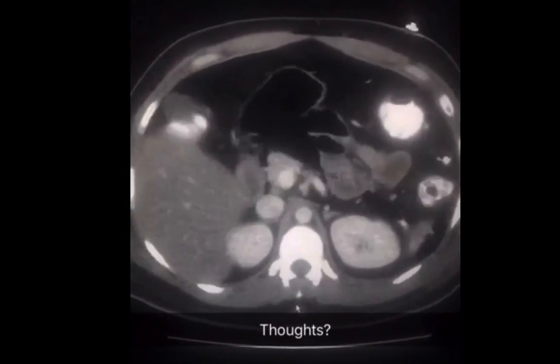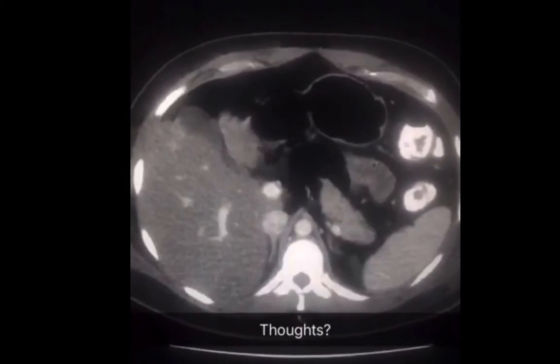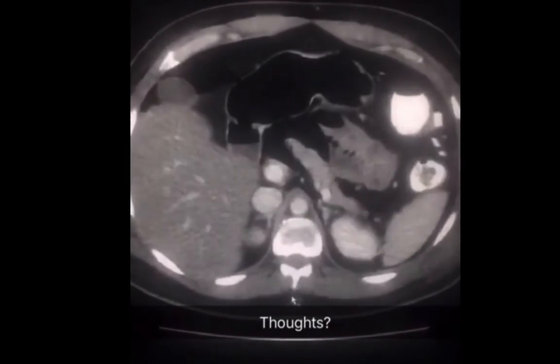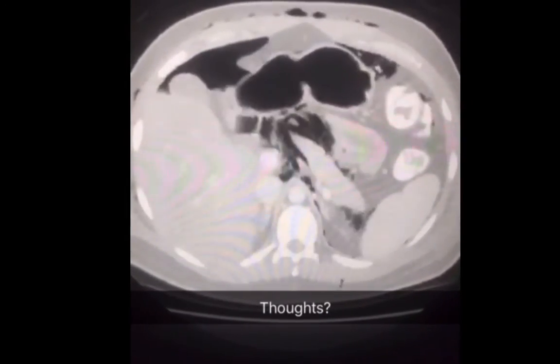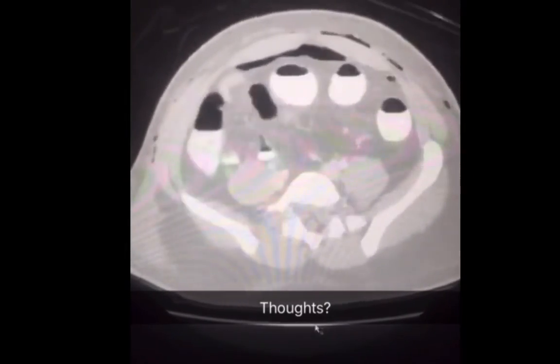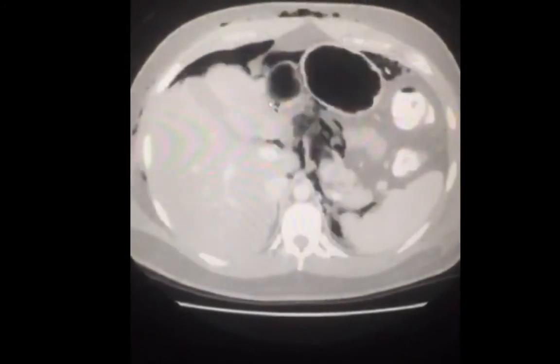This is a CT on a 34-year-old male patient who presented with abdominal pain after liposuction. There is subcutaneous air which is expected after liposuction. However, the intra-abdominal free air is not a normal finding.